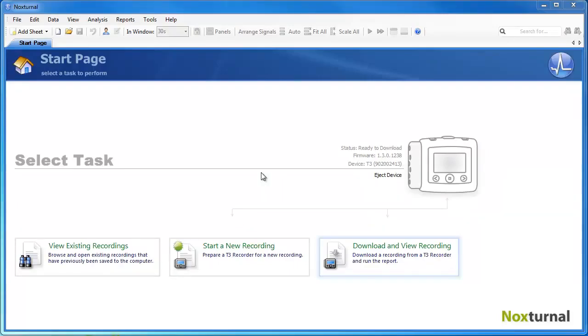There is a different method if you want to make default settings available for all computers on a network, and it requires some advanced administration for the domain. To do this, you need to take your global settings file that you have created on some computer and place it on a network location which is accessible by all the computers on the network that need to read the global settings or the default settings.